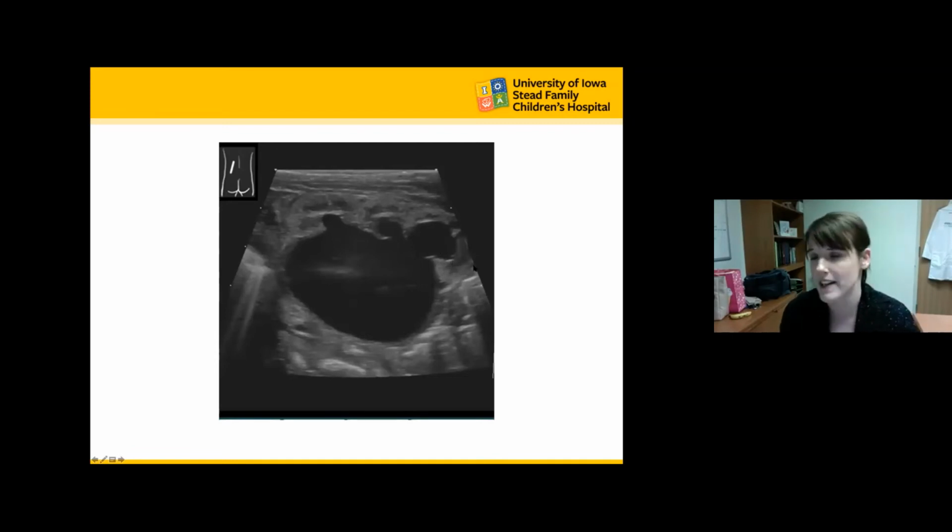This is not perfect by any means, and this is not cut and dry. The whole point of these slides is really to just illustrate that two different people looking at an ultrasound using SFU grading or any type of grading really could easily call it two different things.